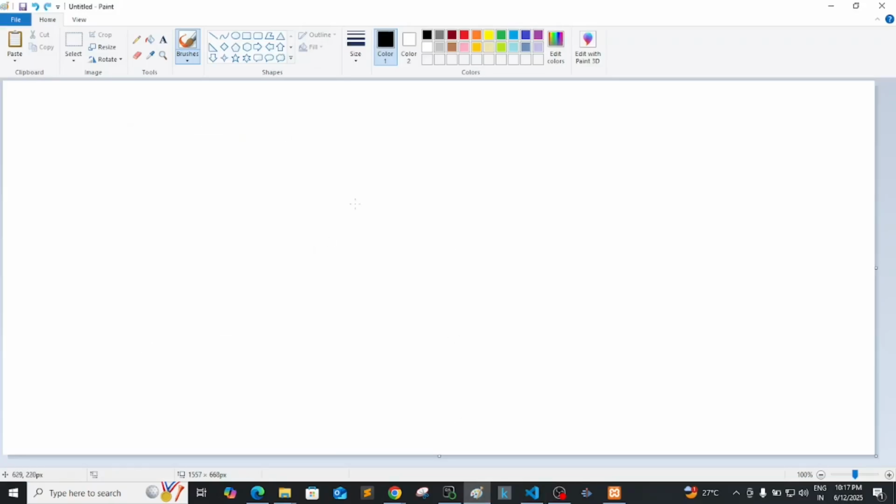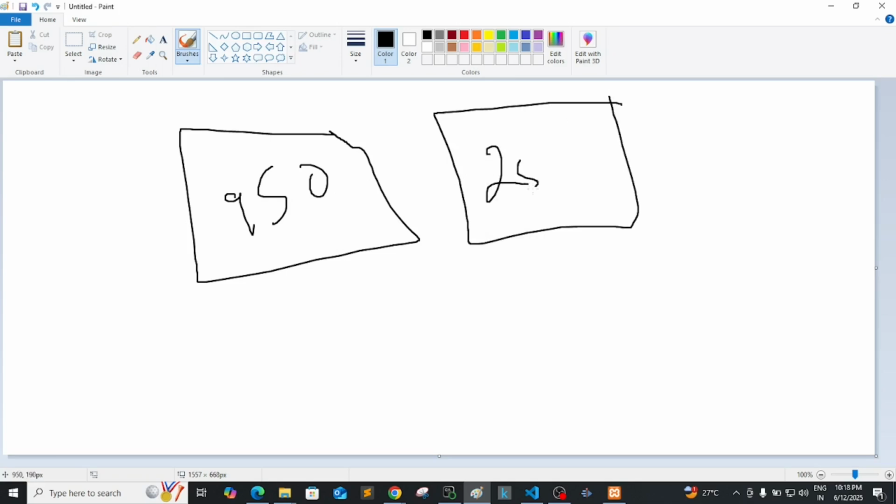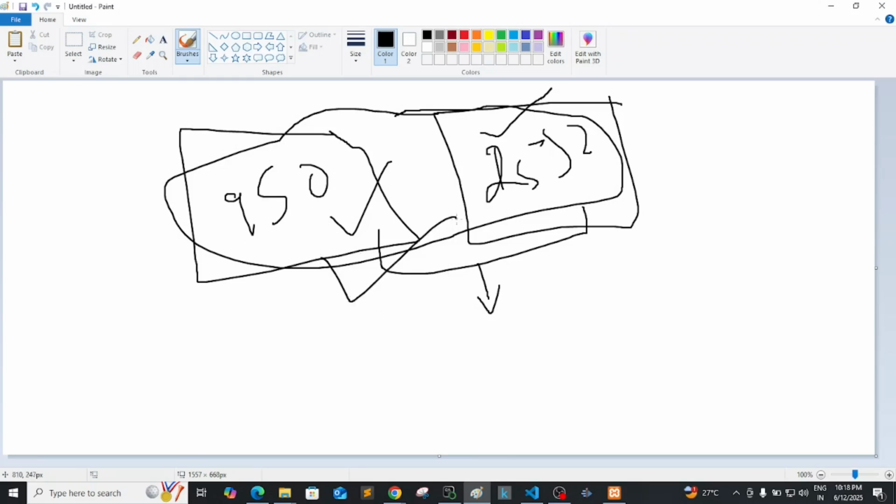And what is augmentation? As I mentioned initially, there were 950 images in one class. There were some other images, 2550, sorry, 1552 images. So this is an imbalanced dataset. Why are those papers not getting the proper accuracy? Why is it getting overfit? So we discussed the third paper was overfitted because he didn't do balancing. First of all, he was using the dataset as it is. So how to balance it?